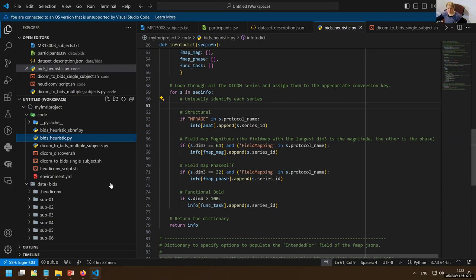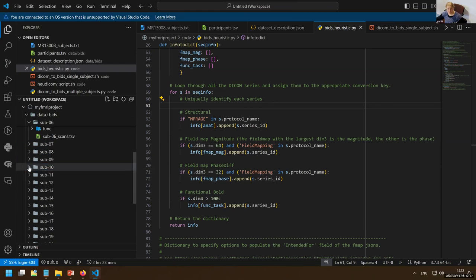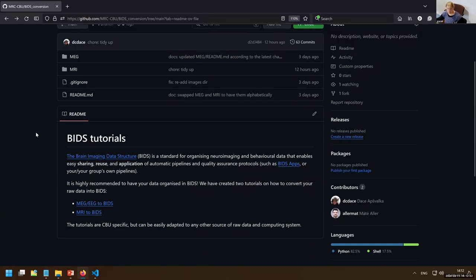So you always need to check whether everything is as you want. So go through and check. But basically, I think it was quite painless for standard cases, at least. It's really pretty easy to convert your raw data to this BIDS format where you have data in NIfTI and you can start to analyze it.